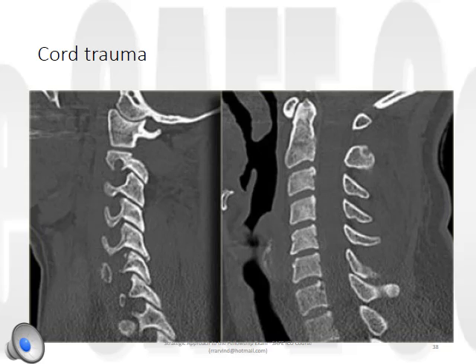The anterior posterior lines are relatively intact, but when you look at the C7 vertebral body, you can see that there is a small fracture there posteriorly.